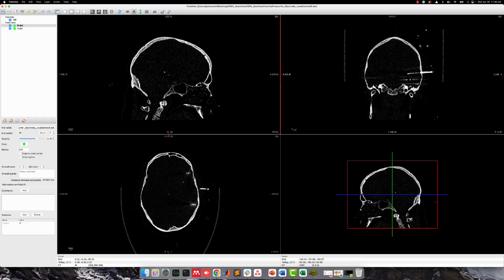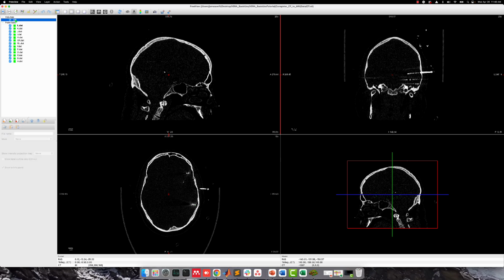At the end of this step, the number of electrodes in each implant has to match the number expected from the electrode definition. Note that if you are using VERA on Windows, you will need to start up Xlaunch with native OpenGL disabled to use Freeview. I typically first show the CT as an isosurface in the 3D view to better compare the electrode coordinates to the CT.